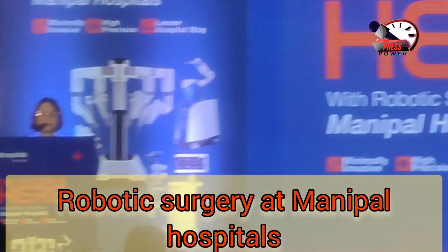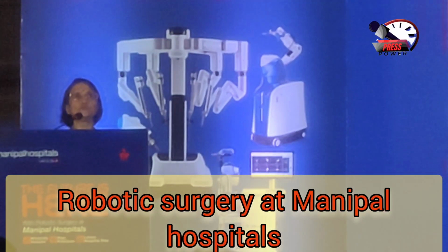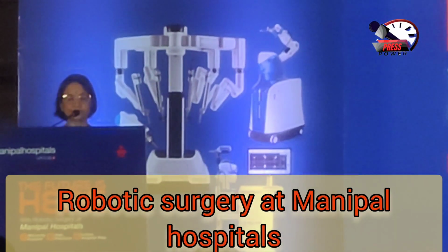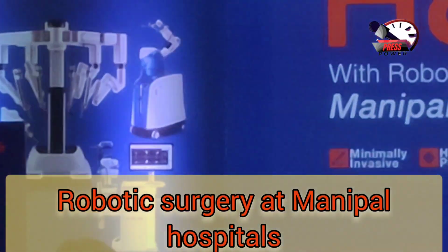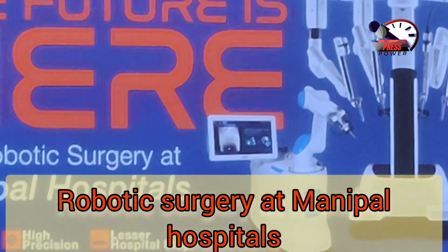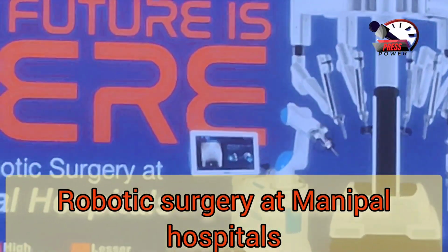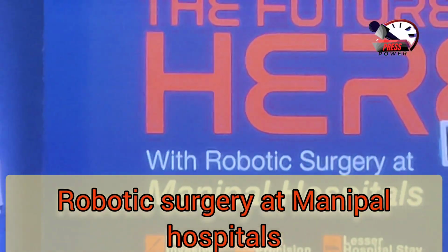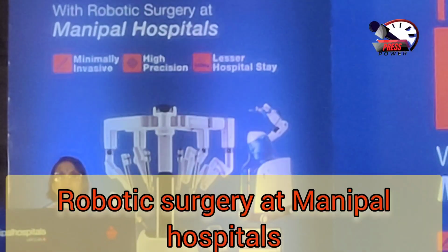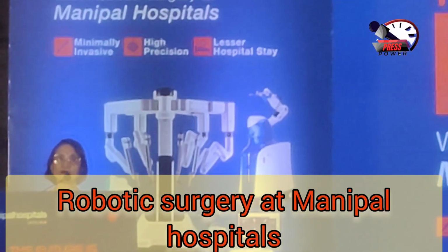How technology can empower medical professionals by enhancing precision, improving patient outcomes, and enabling minimally invasive procedures. As someone working in the field of AI, I strongly believe that the future of healthcare lies in the collaboration between medicine and technology. AI and robotics are not here to replace clinicians, it's just to assist clinicians such that they can handle the operations ethically and in a better way.